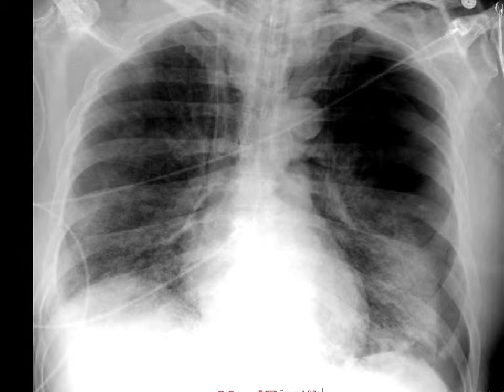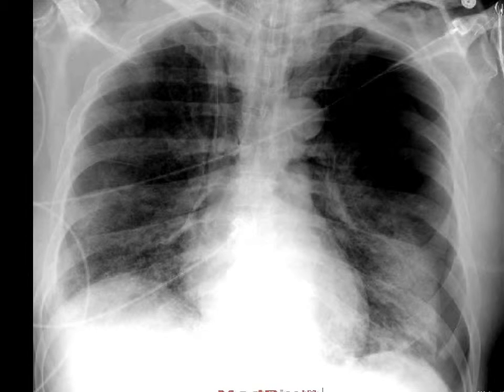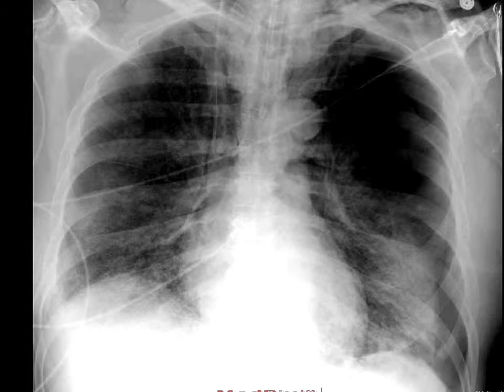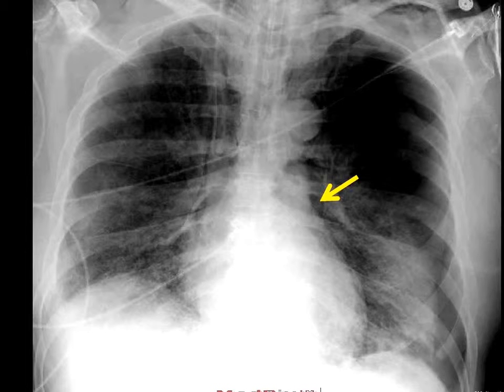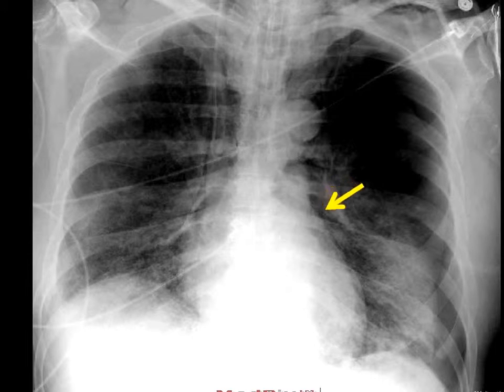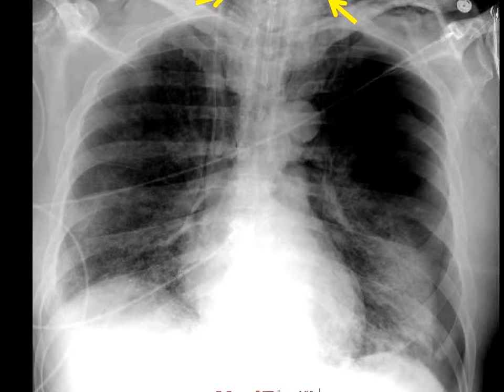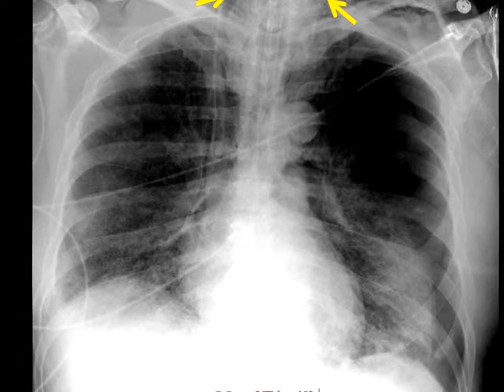Again, on day 6, a second chest x-ray that day was performed. This was for worsening respiratory distress. We can see the ET tube is still in the trachea. When we look at the mediastinal structure, we see that the pneumomediastinum appears to be resolving, although not completely resolved. We continue to see subcutaneous emphysema in the soft tissue of the neck bilaterally.